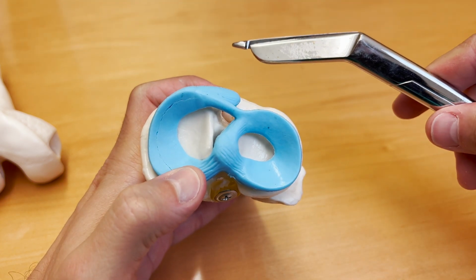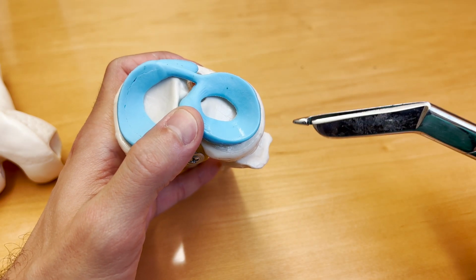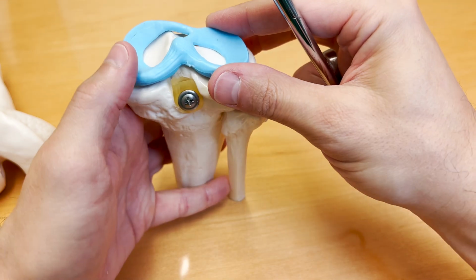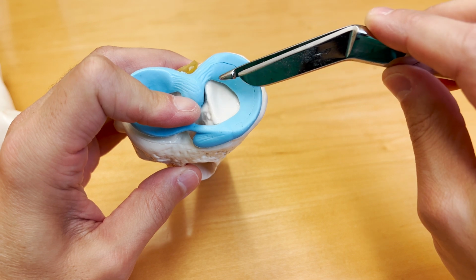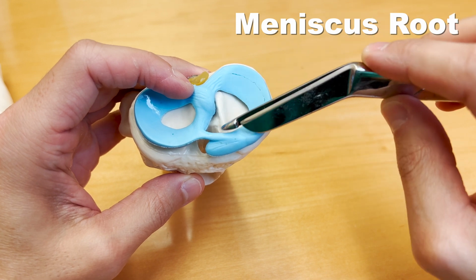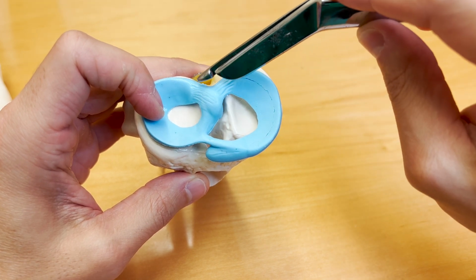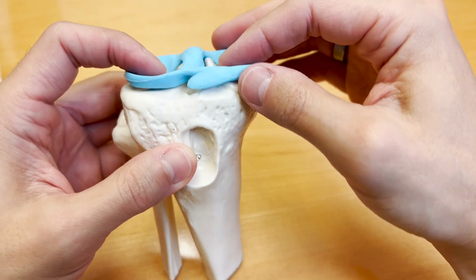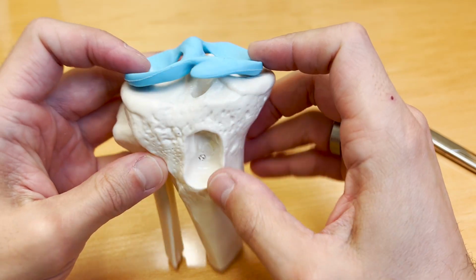So this is the front of the knee up here, anterior, and this is the back of the knee, posterior. The lateral side is over here, and the medial side is over here. So we call this the lateral meniscus, and this is the medial meniscus. And normally on a real knee, the meniscus is anchored to the bone in the front and the back at what we call the root attachments. So there's the root attachments on the medial meniscus, one in the back, one in the front, and then there's the attachments to bone on the lateral meniscus, one in the back, the posterior root, and one in the front, the anterior root. You can't really see that on here just because I have to take this meniscus on and off, but that's the general basic anatomy of the meniscus.